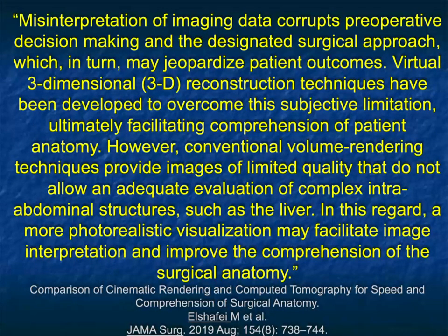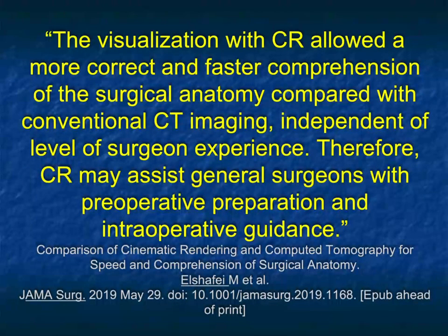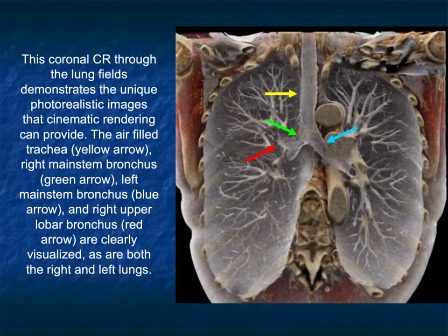When we talk about using cinematic rendering in surgery, we always talk about surgical planning, intraoperative thinking, but what about just learning? I think one of the easiest things of cinematic rendering and one of the easiest touch points that will work for augmented reality is just education. Okay? Learning anatomy, learning it in the volume, it's a lot better than learning it in the pictures or learning off static slices. Cinematic rendering may assist surgeons with preoperative preparation and intraoperative guidance, but it's the learning process. And we did some work with this, and I'll just share some examples.